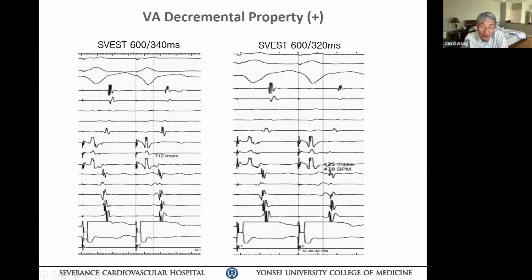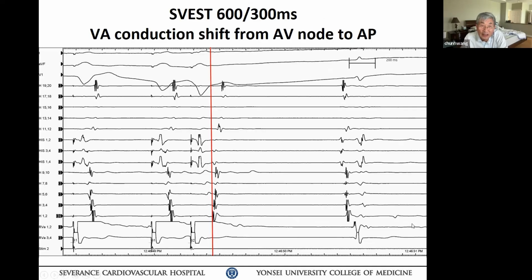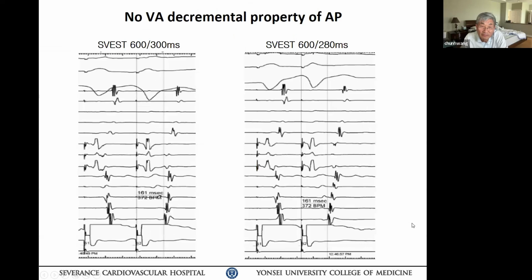Okay, that sounds good. Keep going. And then, so that's okay, keep going. So if you look at this slide here, during the V extra, take a look at it. Your septal activation, this is clearly septal, right? The first complex is 600 milliseconds. CS activation, take a look at how it looks. That should be normal VA conduction in this patient, right? Not like you saw before, where distal CS and proximal all line up. And then finally the AV slow pathway blocks, and then it goes through the accessory pathway. So you can look at the His timing clearly later. Okay, all good, keep going.